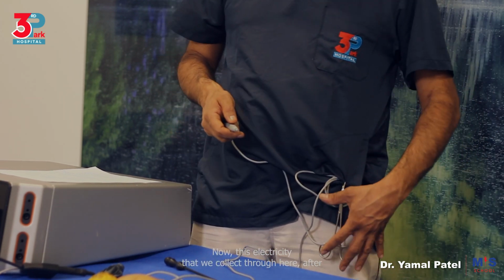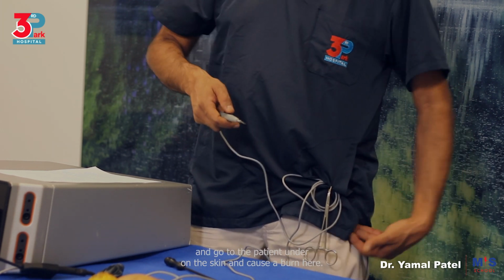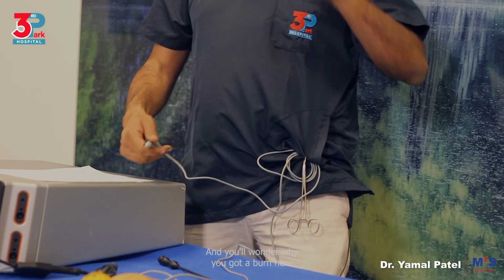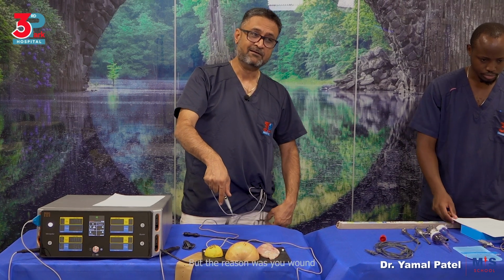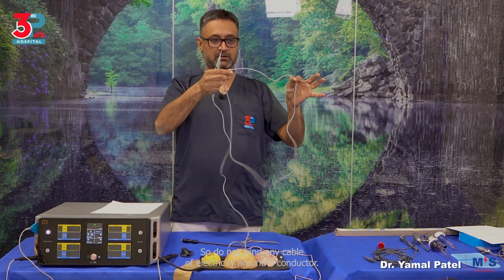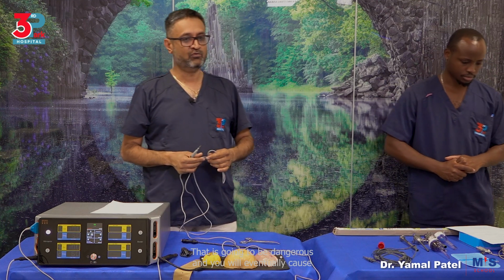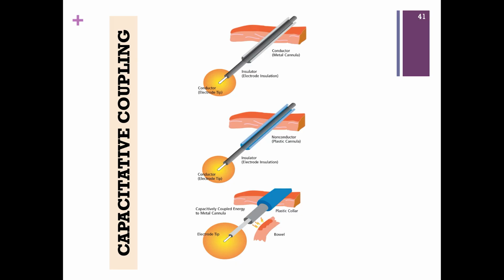Now, this electricity that will collect through here, after it reaches a certain amount in collection, it will jump through and go to the patient under, on the skin, and cause a burn here. And you'll wonder why you got a burn here when all you did was operate here and nothing here. But the reason was you wound this cable around a conductor. So do not wind any cable of electricity around a conductor. That is going to be dangerous, and you will eventually cause collection of electricity here, and it will eventually jump off to the patient. So that is capacitive coupling.